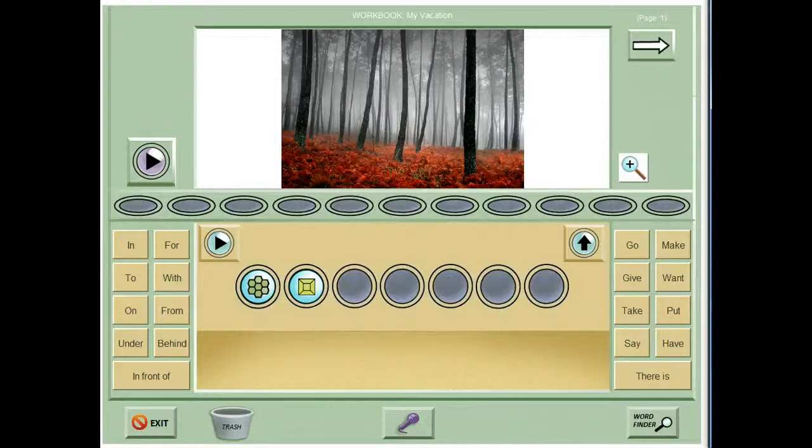If you run into word finding problems while you're creating speech on Sentence Shaper, the program offers two kinds of help. First are the vocabulary cue buttons along the sides of the screen. When you click a cue button, it plays a recording of the word shown. Then you repeat the word in your own voice and add it to your sentence.